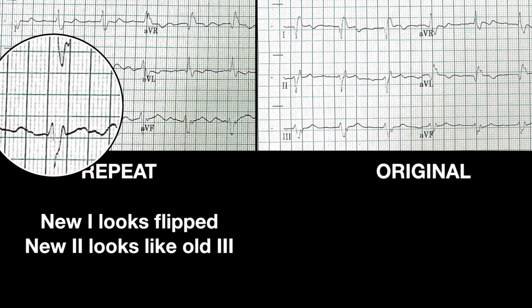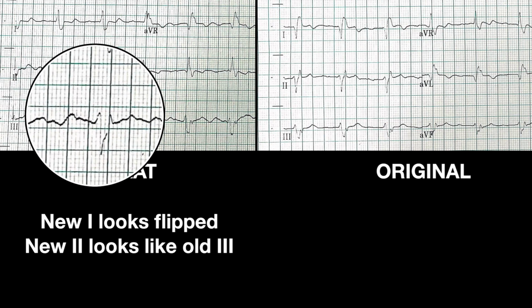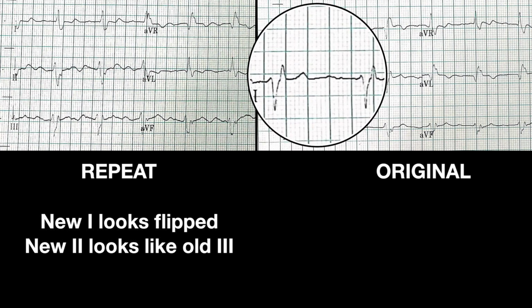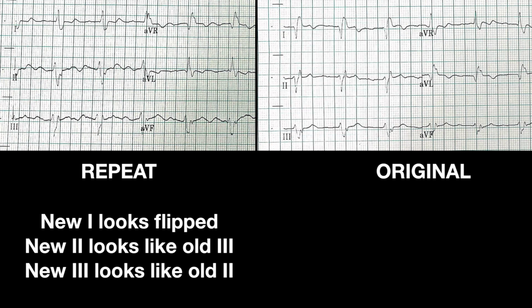And then when I look at lead 3, you may see where this is going. I see a little positive hump, negative deflection, another little positive hump. When I compare that to my old lead 2, I see little positive hump, negative deflection, little positive hump. New lead 3 looks like what old lead 2 looked like. You might be seeing a pattern already.